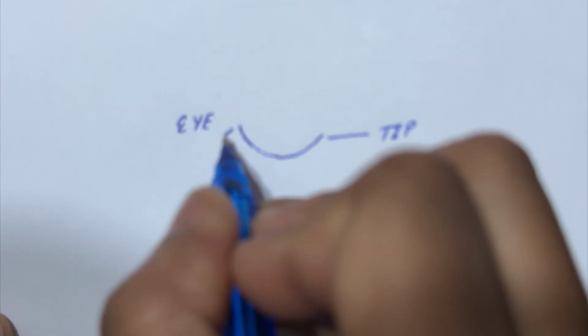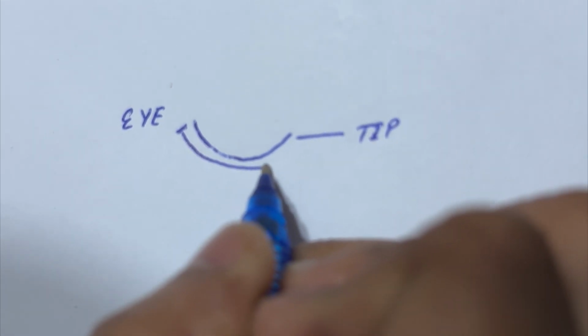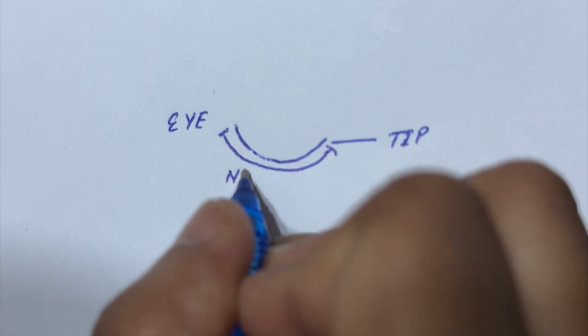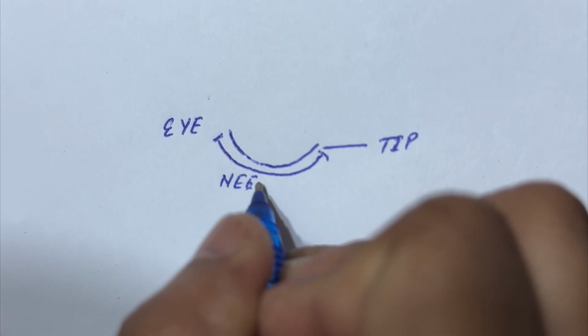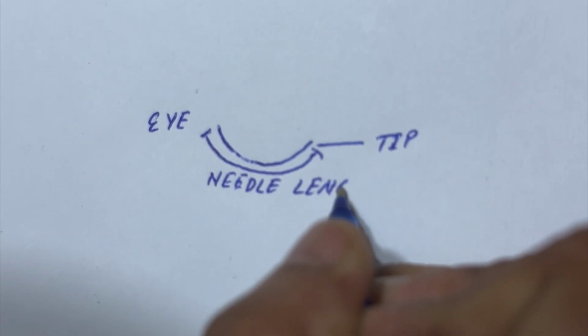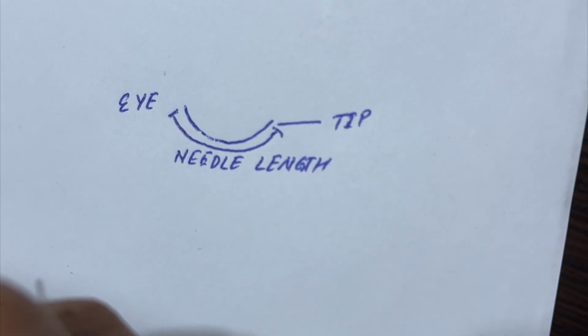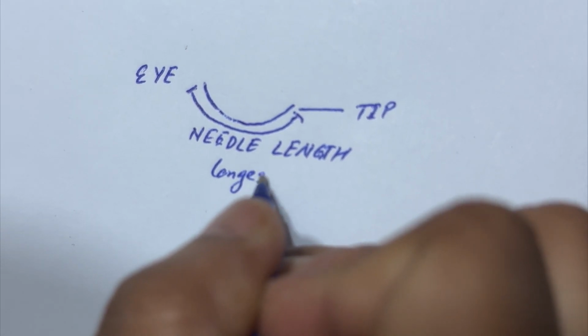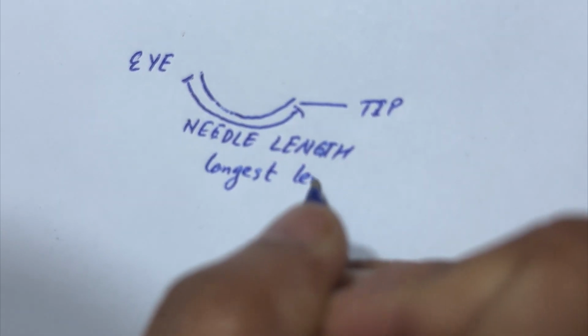So the distance from here till this one is the needle length, okay? This is the longest length.